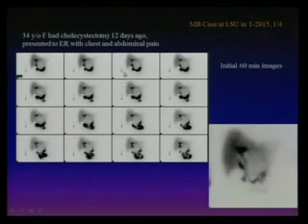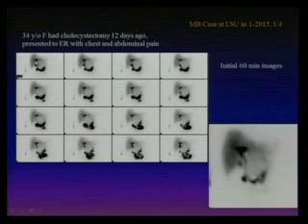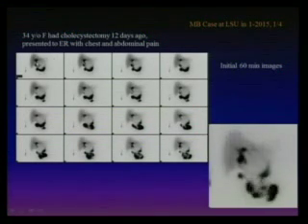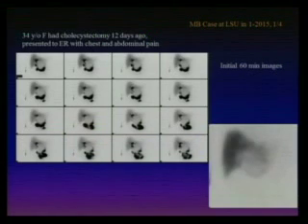And then you look for the abnormal. You always just raise the question. You may not make the diagnosis, but something should not be like that. The intrahepatic left duct is too prominent. And this one looks like gallbladder, but the patient doesn't have a gallbladder. So you have to question what that is. Probably a leak, could be a biloma, so do a delay.